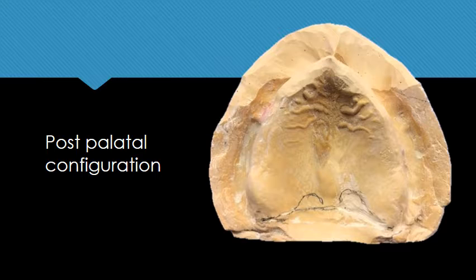Using a small wax spatula, the widest end of the spatula should be used to scrape a depression into the stone, beginning from the deepest portion of the beading and ending anteriorly as a feather edge, and follow along the butterfly configuration.